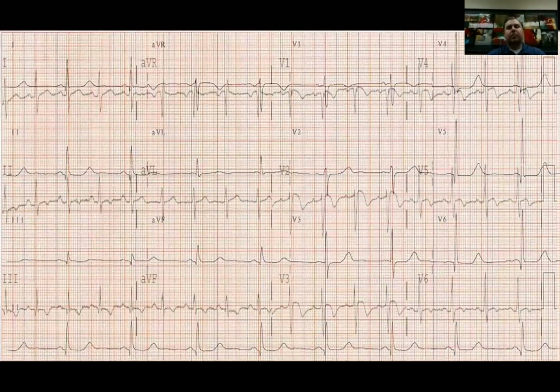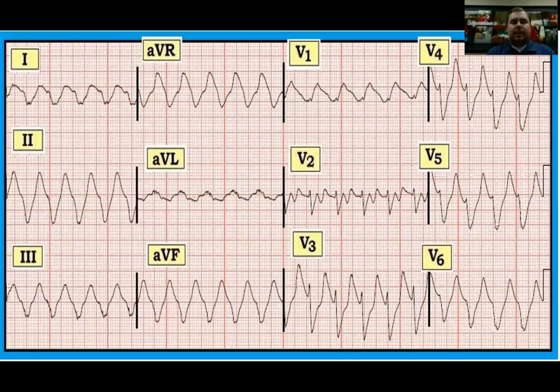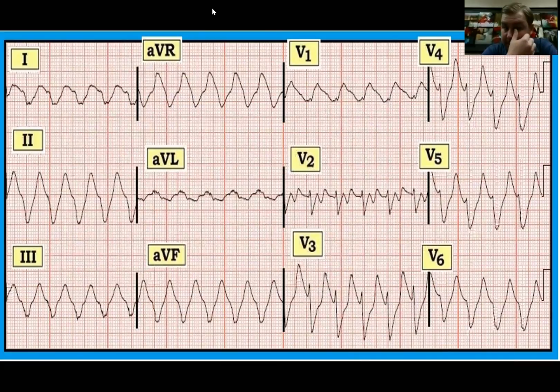All right, so here's the hardest EKG to really evaluate, especially for axis, but we'll go through it pretty slow. And it's really easier with patients because you're going to be able to get information either from them, from family, or from their presentation. So you get this 12 lead, immediately it looks abnormal and a little bit terrifying, but we're just going to start from the beginning.